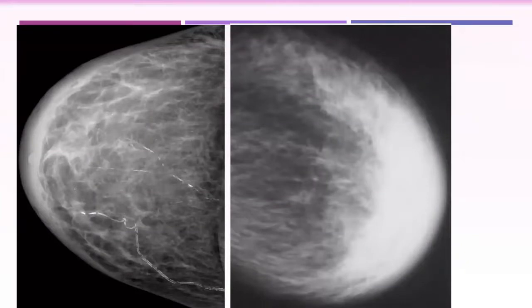Okay. Now the floor for Hind, I think. Hind or Suhair, I don't know. Who's the one? I don't know. Okay, can take it. Bilateral CC. No, this is a different patient.